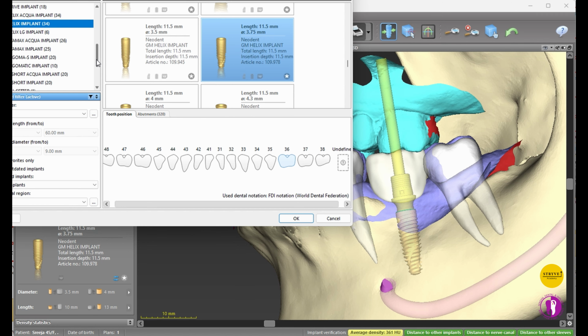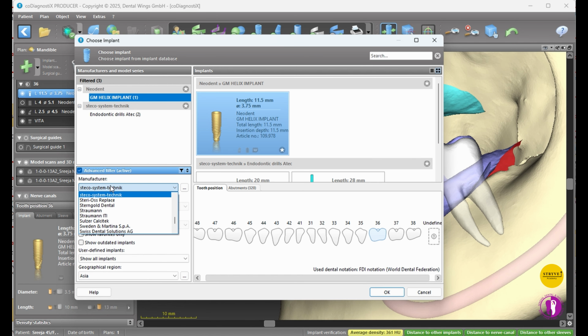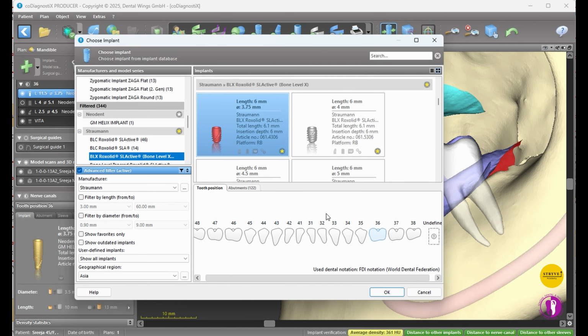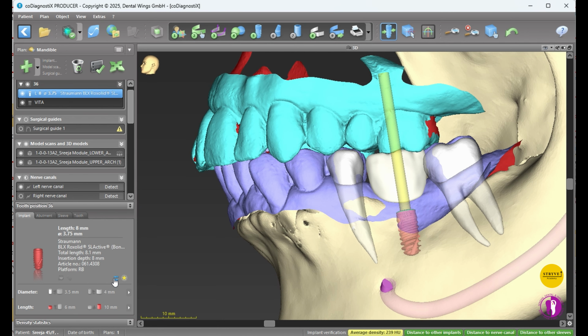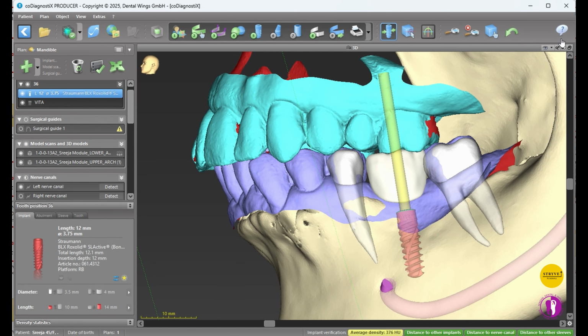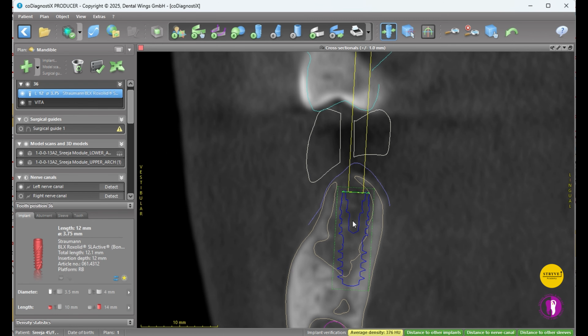Now what we are doing is we are just changing the implant from this to another one. That can also be done. Say suppose in the same case I wanted to do a Straumann, just change the implant to BLX or even TLX. Okay. You already know it is about 3.75, right? 3.75 instead of 8, I will be changing it into 12 or 14. Okay. So now 12, and we are going to change the abutment.